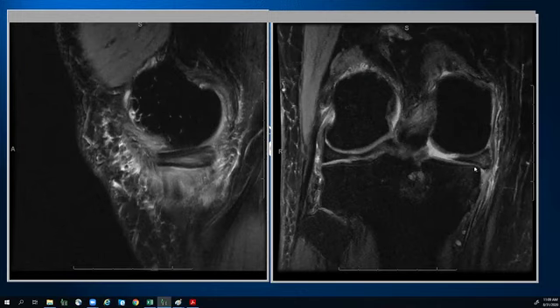But I hope that seeing a lot of these examples has given you a good foundation of what to think about when you're looking at meniscal tears, and how to build that 3-dimensional image in your mind, creating these scenarios of what it looks like in 3 dimensions. If you're able to do some of this, then the more cases you see, the better you'll get. I would recommend not only seeing cases, but following up to the op note and seeing if the surgeon agrees with your diagnosis, and that builds a reinforcement pattern where you'll feel like you're getting more and more accurate at looking at these types of tears.